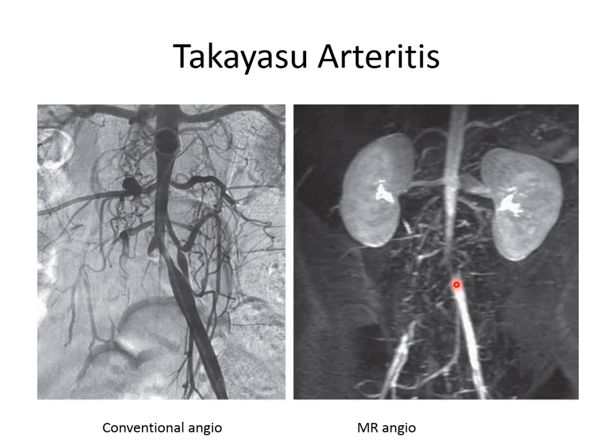The most important topic today is Takayasu arteritis. It is large vessel disease, so mainly affects aorta and its branches. From the name, arteritis, so it's the inflammation of the wall. It causes many things to the aorta because it's a diseased wall. So we can expect narrowing, thrombosis, occlusion.